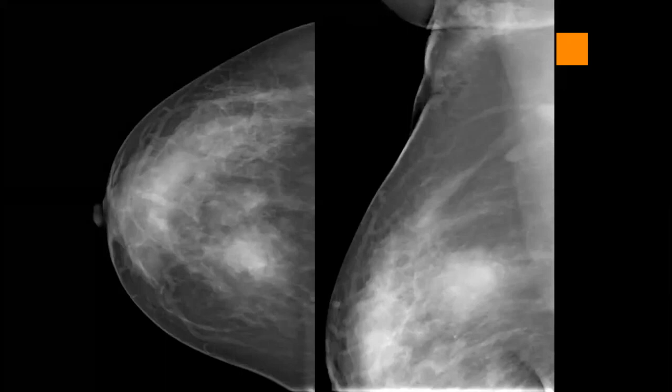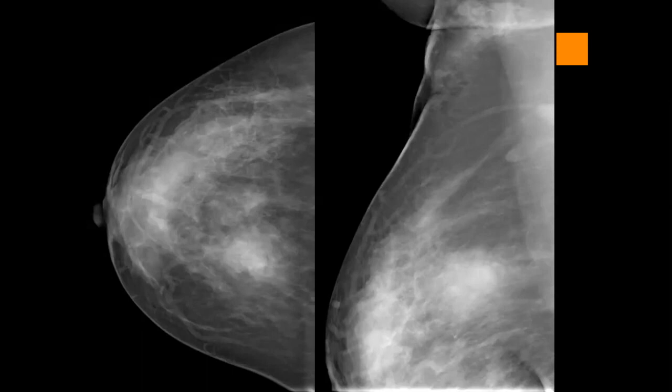No. There are no spiculations. This is an indistinct mass. Irregular, indistinct. The only criterion is an indistinct mass. See? So indistinct, and equal density, it will be BIRADS 4B. And this lesion was an inflammatory cyst. Okay, it is 4B.